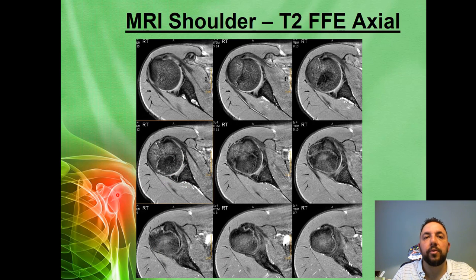the evaluation of the labrum, both anterior and posterior. You see a little bony pathology in the scapula as well. So you get a pretty decent look, a decent overview, and gradient echo axial in the shoulder is a standard sequence.